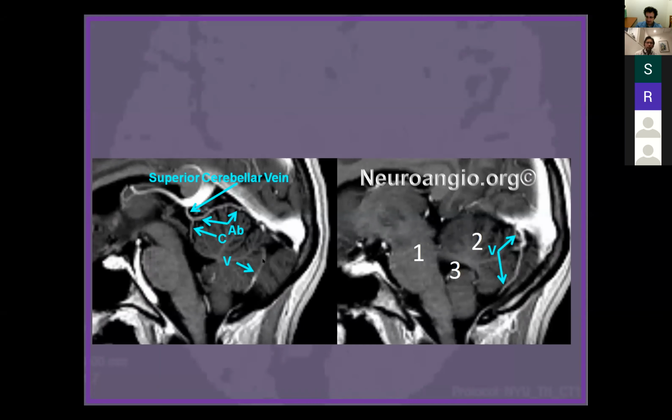Number two, again, we're thinking in terms of applying a method to this. So one method is this idea of balance, looking overall at what's dominant. The other is number one, so using cross-sectional imaging. We'll talk a lot about that. We'll show some examples. And that's something that Yun's generation didn't have. We have superb cross-sectional imaging. We have amazing MRs. We have venously contaminated CTAs or CTVs. And you could use these to great advantage to understand where the veins are.